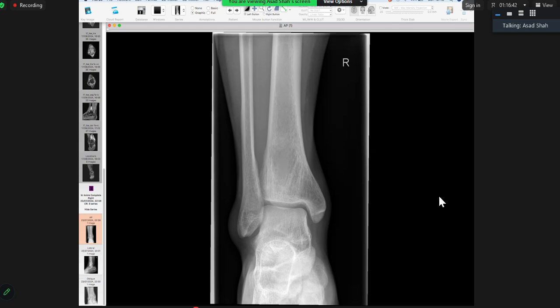Okay, next case now. I'm gonna pick that up. Give me a second. Okay, what's that? Yes. Okay. I get the plain film. It's always useful to start with a plain film rather than the other way around. Yes, I got it. Great.